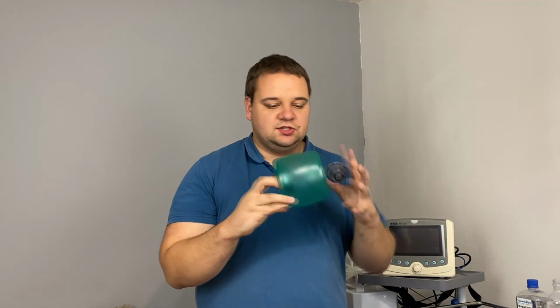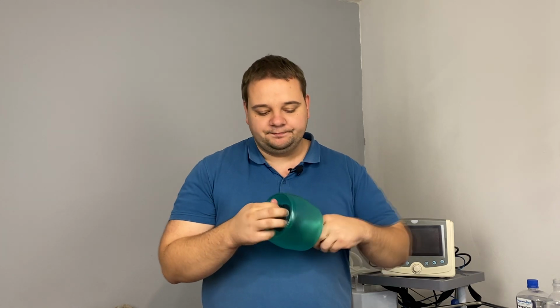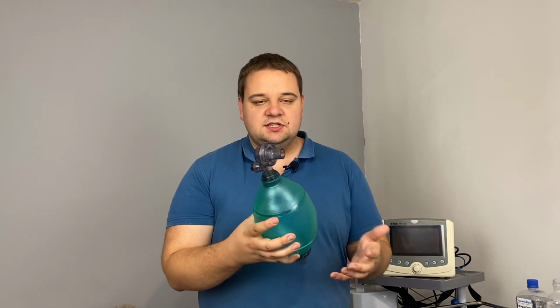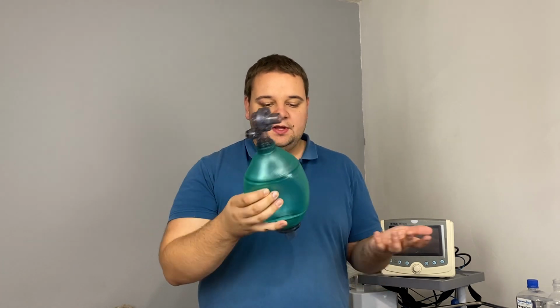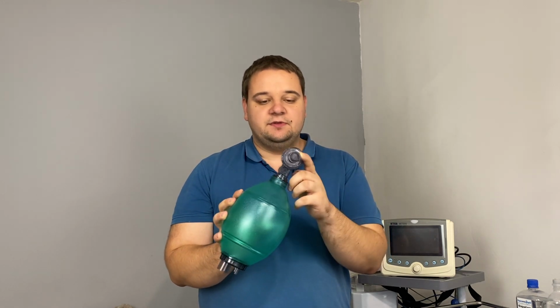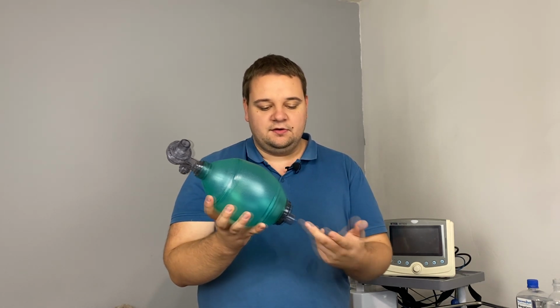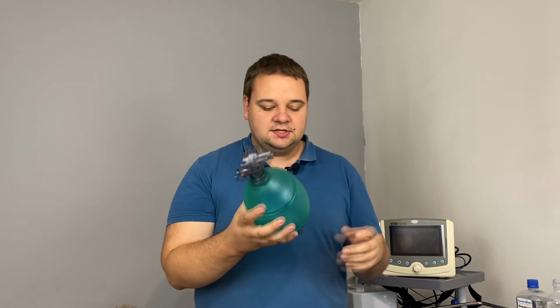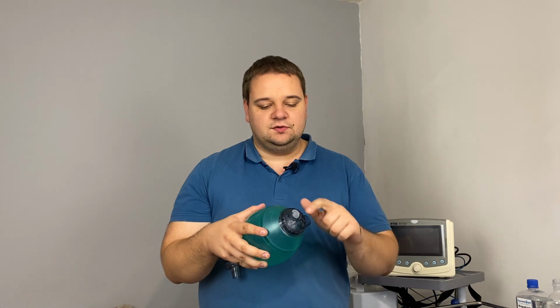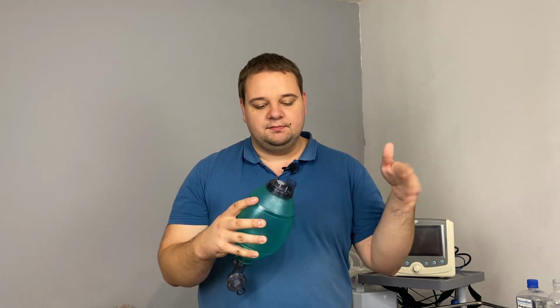Here is how it looks, just for storage. Now we can spread it so it will work fine. And by pressing the bag we get the ventilation. Here is the out port for the air. It gets the air from this part, gets air into this part. We can also attach oxygen if we have to, due to some need of ventilation during cardiac arrest, for example.